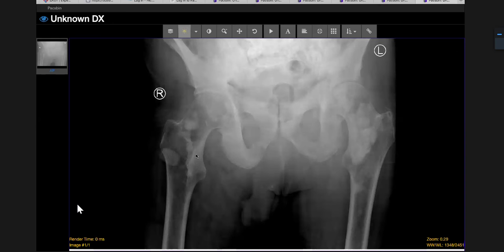In a patient, am I all right to think this patient is a male? Yes. So I think the first differential that I would think of is metastatic prostate cancer. It is. Okay. So then I think I would discuss my findings with the clinicians. And if it's not diagnosed already, I think this patient would need prostate imaging and workup, and discussion. What else can they do to find out if it's likely to be prostate cancer clinically?